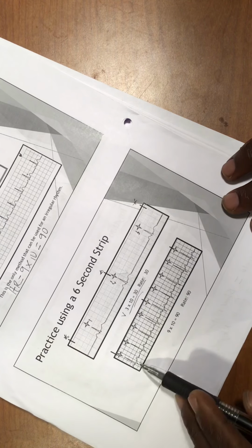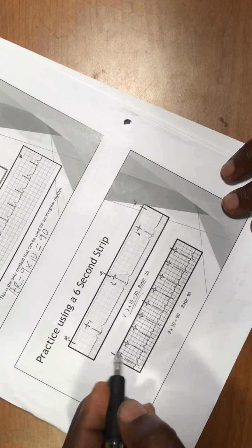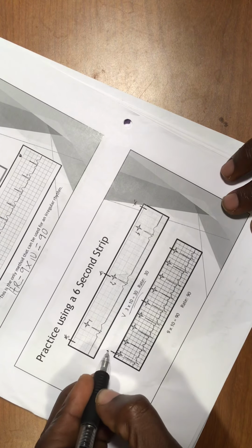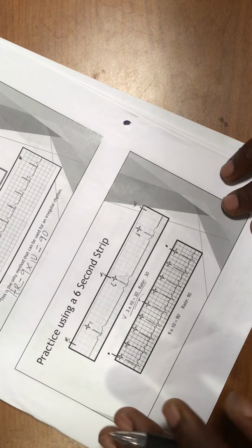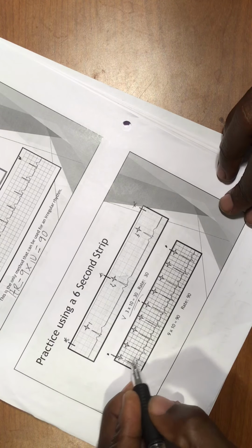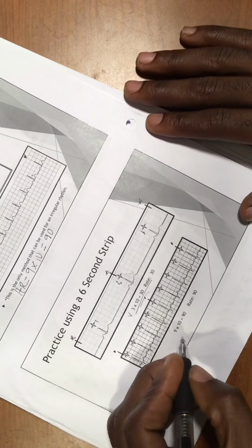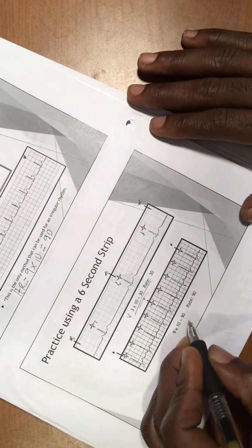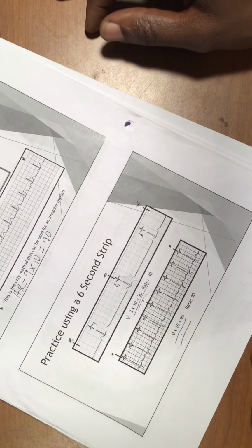So if we look at this one, I told you we will have this line right here. They will always be in the EKG. So you go right here and measure all the QRS complexes. If you can count with me, that would be awesome: 1, 2, 3, 4, 5, 6, 7, 8, 9. That's 9, so you multiply 9 by 10. You're going to have 90 for the heart rate. Very important and very simple.